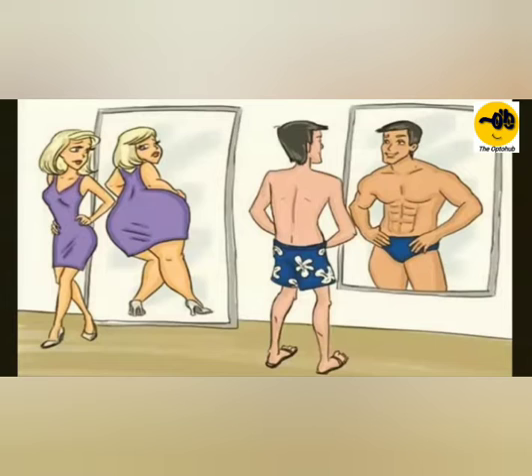Now the type of light, whatever it is sending back, will be captured by the camera in the topographer, and then computer analysis and algorithms will be used, and it will give you the analysis. So basically you have to remember that with the topographer, the cornea acts as a funny mirror like we see in amusement parks. What image you send, what light you are sending, and what you are receiving back, the difference between those, the computer does the analysis and it gives you the results.